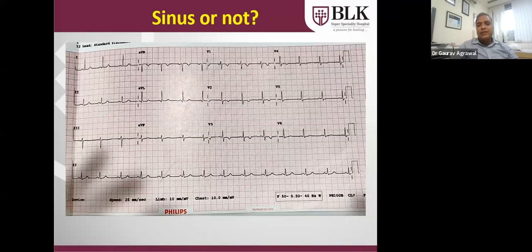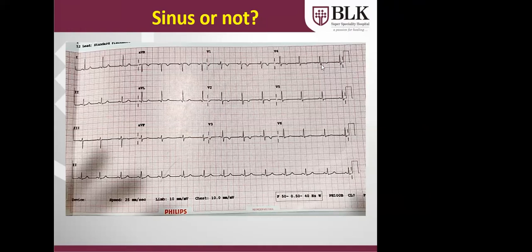Residents, please comment whether this ECG is sinus or not. Let it be somewhat interactive. You can mention in the chat. Dr. Chandrika, yes sir. Is this sinus or not sinus? Sir, it is sinus rhythm.